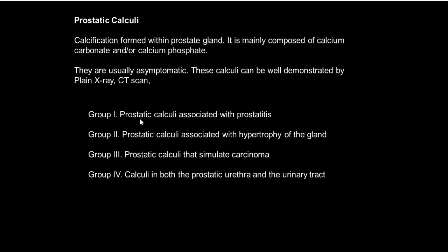Prostatic calculi are one manifestation of prostatitis. This is a common finding: prostatic calculi, prostatic concretion, calcification formed within the prostate gland. It is mainly composed of calcium carbonate and or calcium phosphate. They are usually asymptomatic. These calculi can be well demonstrated in plain X-ray and CT.